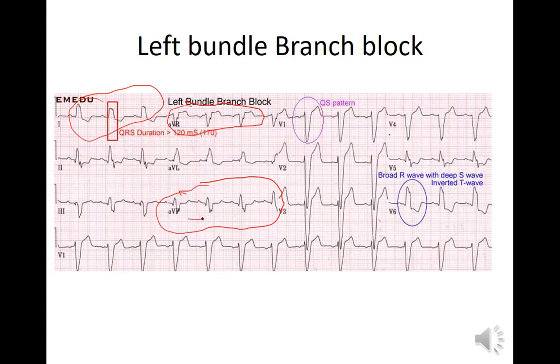But what do you have in AVF? Is it positive or negative? I think it's negative. Yeah, more negative too. What's that top thing? Oh, that's the S. So lead 1 is up, lead AVF is down. What do we have? Axis deviation. Be careful.